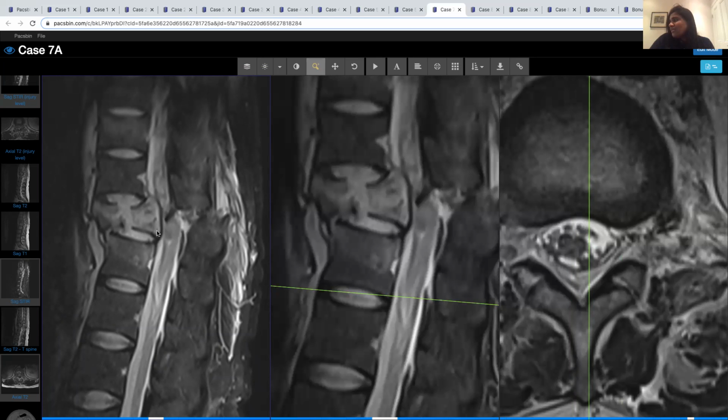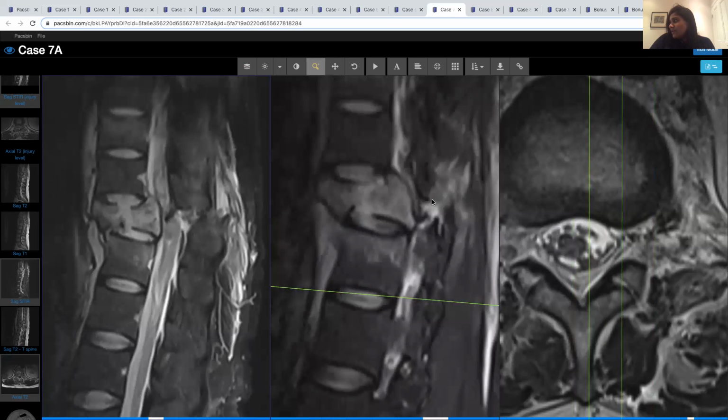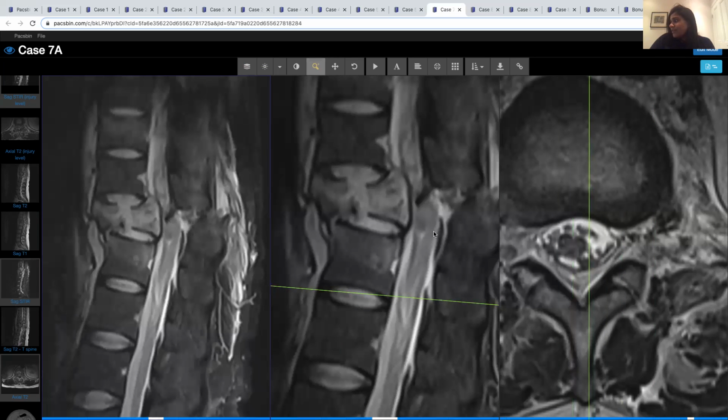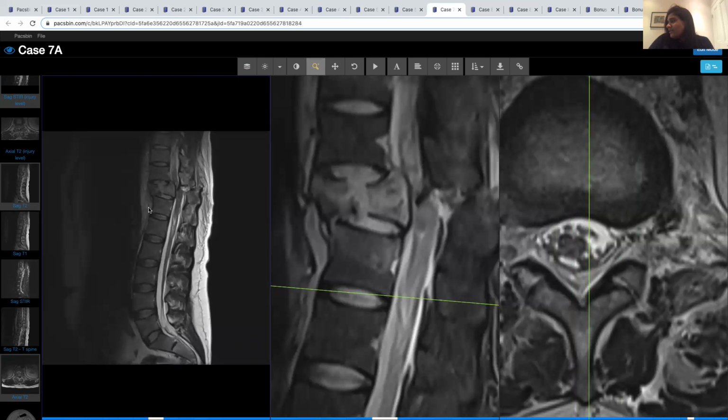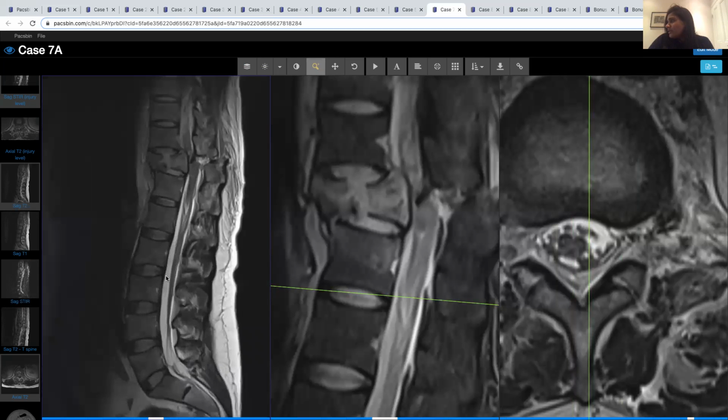We can't see that black line, it's become discontinuous here. And here we've got quite a stunning flaval defect. So we've got a flapping of this ligamentum flavum in the breeze here. So this is the flavum, and a disruption of the flavum at that level.